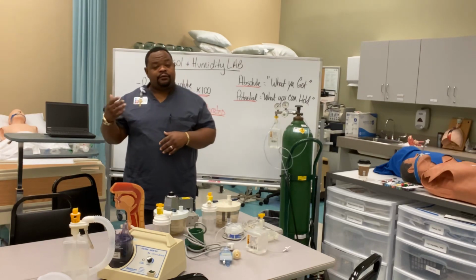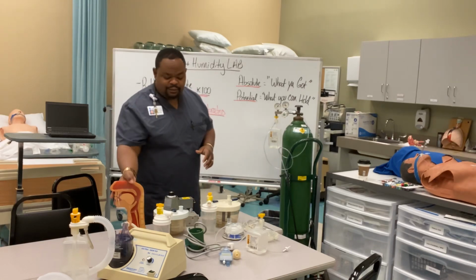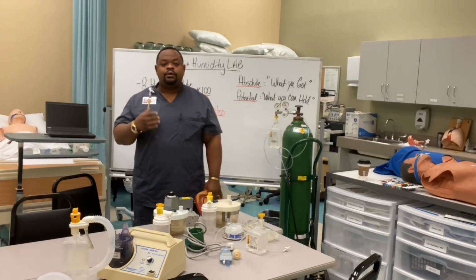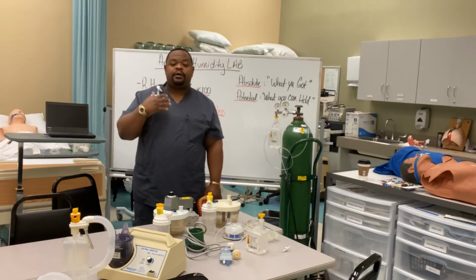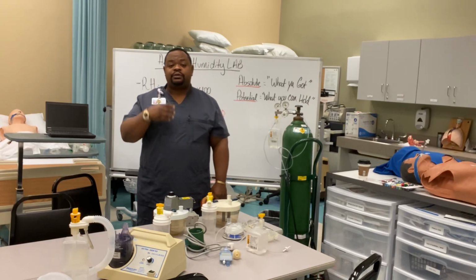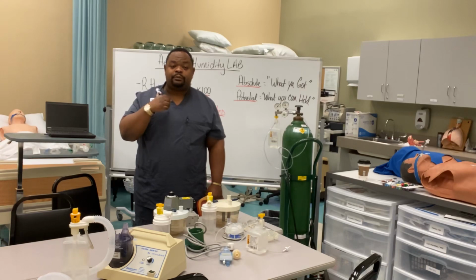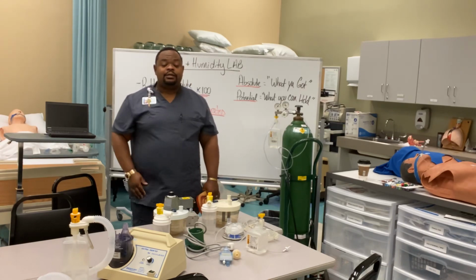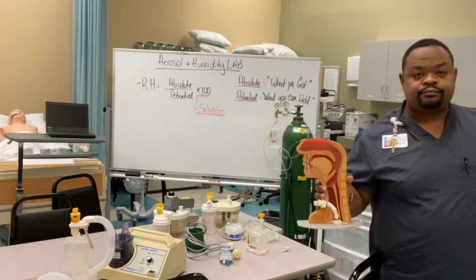Okay. Now we talked about humidifiers as far as aerosol and humidity is concerned. We said that humidity is absolutely necessary, right? Especially if my patient's nose or upper airway has been bypassed, either from trauma or some kind of surgery, where they have to have either an endotracheal tube in place, or if they have a tracheostomy, okay? So I'm going to show you up close what you're bypassing, okay?